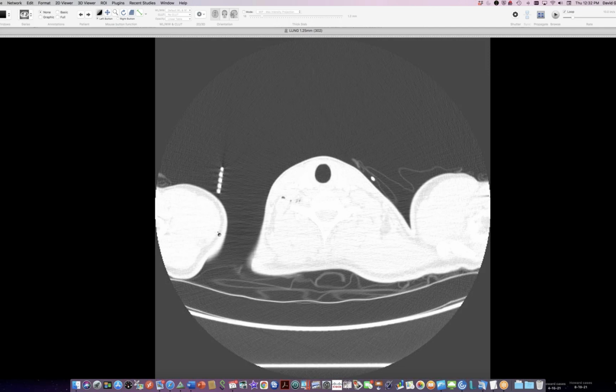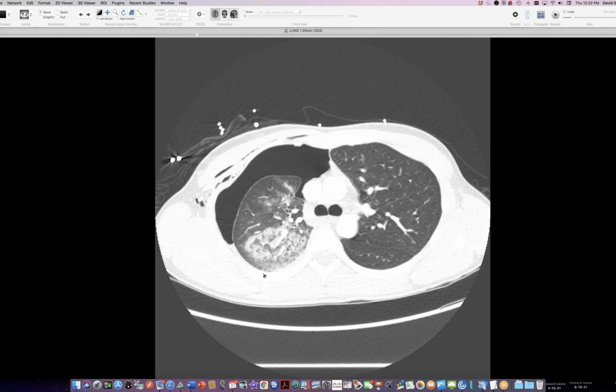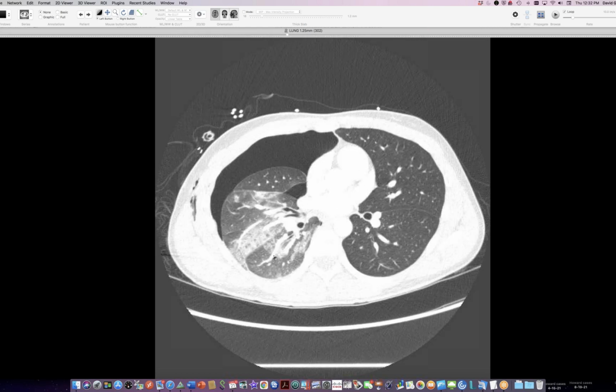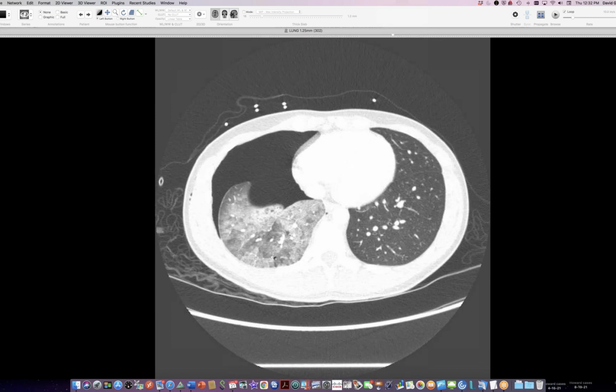We did get a CT scan a few days after this had developed, and you can see that it doesn't really look like lung edema. It's a patchy abnormality. There are not a lot of septal lines to go with ordinary watery edema. It's a patchy lung injury pattern.